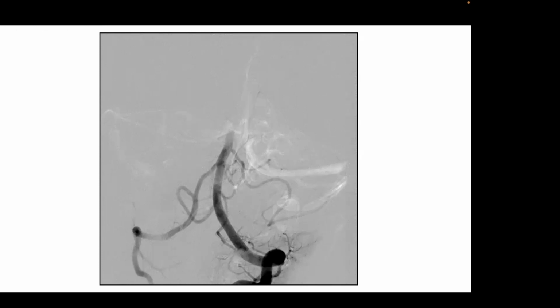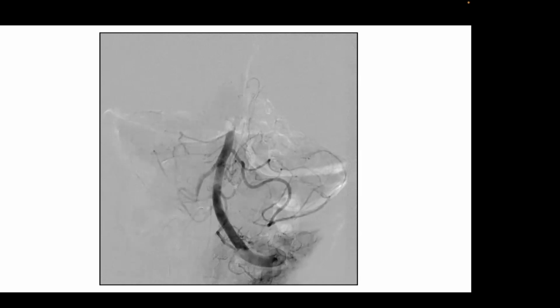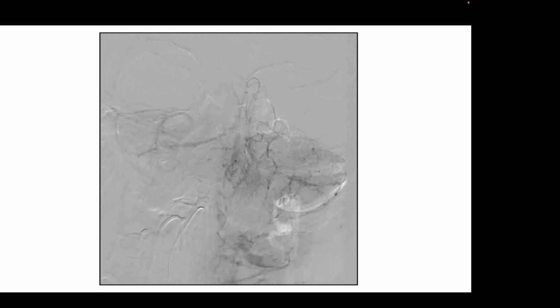There's this truncation of the basilar, and we're actually refluxing down the opposite vertebral artery, in this case with an occluded basilar artery. And this was treated with... I don't think I have it, but this was treated with thrombectomy. But not all patients... here we are, post-lysis or thrombectomy.